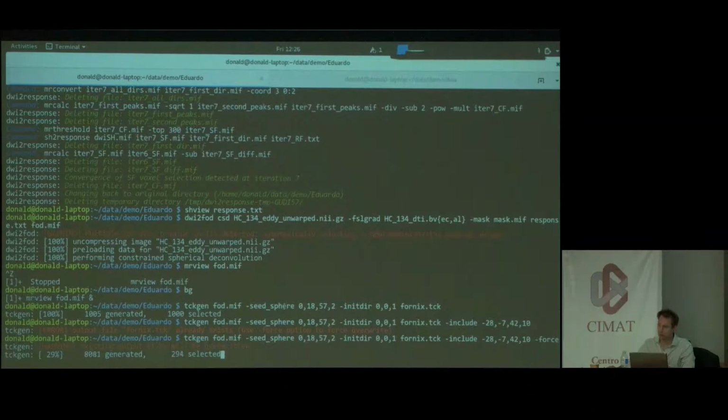And we'll see. Does the memory mapping work for the TCK? Because it's a variable size file, and because the tracking buffers the output to write a bulk bunch of data in one go. Version 2 used to. Yes, it used to. It was actually quite hard to get it to work, to prevent bus errors particularly.